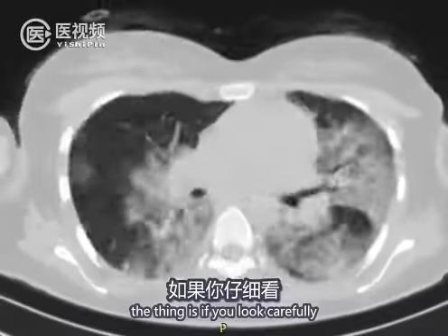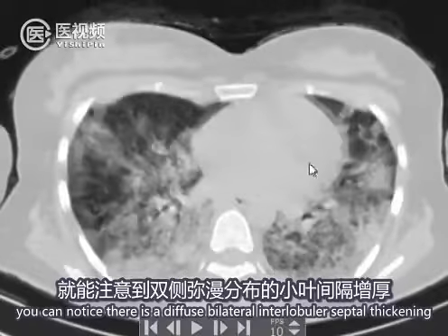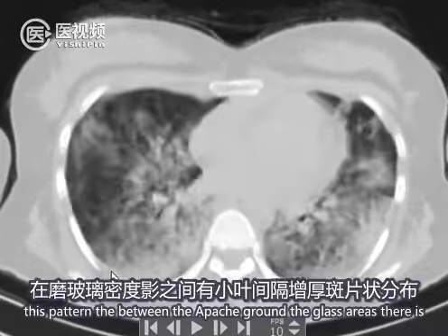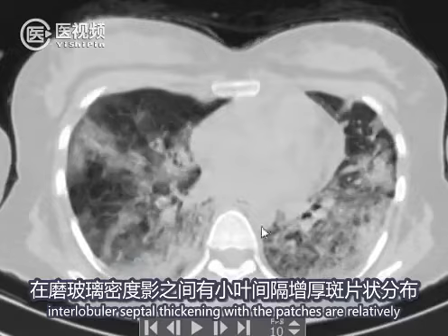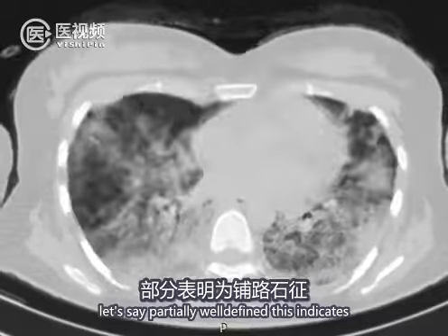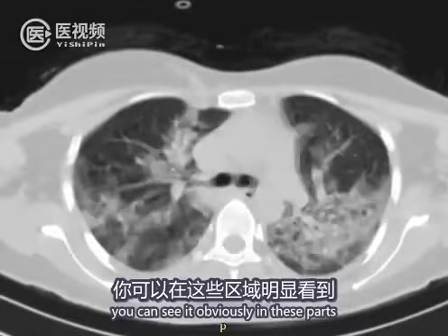If you look carefully, you can notice there is a diffuse bilateral interlobular septal thickening that you can see between the lobes, like here and here. This pattern, between the patchy ground glass areas, there is interlobular septal thickening, with the patches being relatively, let's say, partially well defined. This indicates what's called a crazy paving pattern.